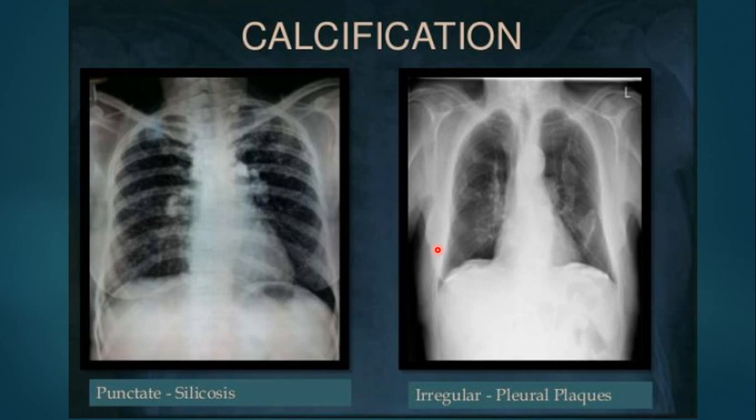Other types of calcifications: we can see punctate calcifications diffused all over the lung. You can see these tiny nodules all over the lung, and you can see the prominent hila bilaterally, and these are punctate calcifications of silicosis. And I'm sure if we look into a magnified view of the hila, we can see some eggshell calcifications of the hilar lymph nodes bilaterally, typical of silicosis.